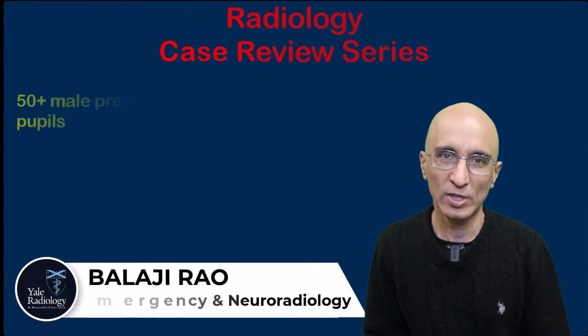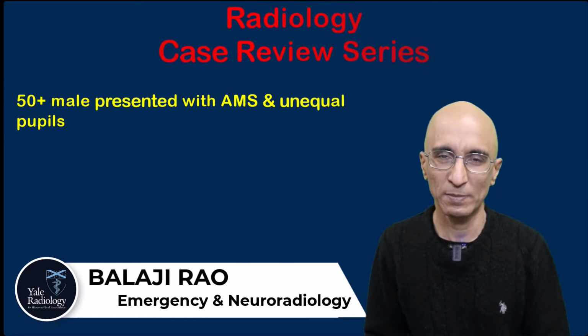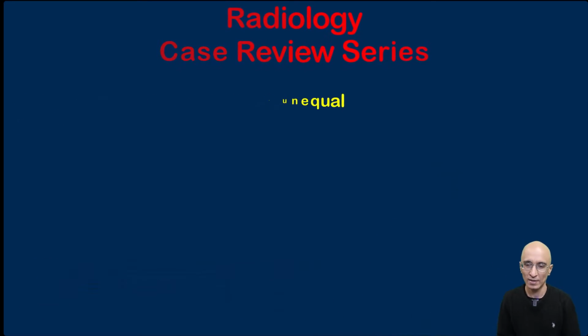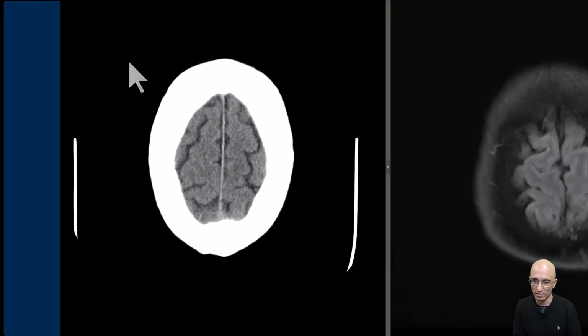In this video, we are going to look at the imaging of a 50-something-year-old patient who presented to the emergency department with altered mental status and unequal pupils. I'm going to start with the CT head images, which is what the patient first underwent.